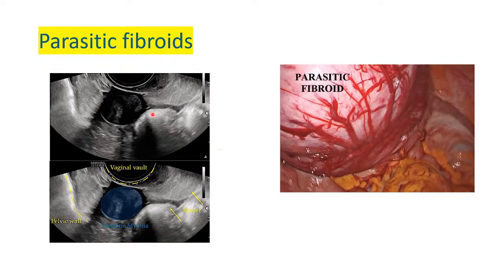We also do have what are called parasitic leiomyomas or the wandering fibroids. So a parasite is something that depends on or feeds on another tissue that is not its parent tissue, where it is originally coming from. So you can see here what we have. We've got a big fibroid there, and you can see there's the mesentery there. The mesentery, this is fat.